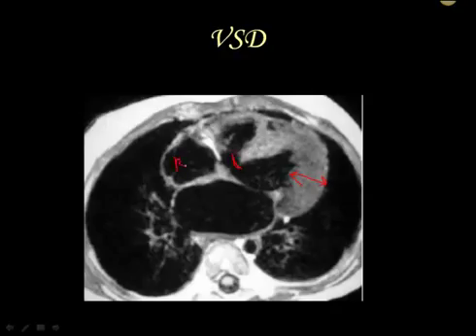First of all, there's your right atrium. There is a rather large left atrium. Here's your right ventricle, and there's your left. So we've got the bunch of them right there. Now, because of this VSD, blood is flowing back this way, and as we just talked about, it's going back up into the pulmonary arteries.